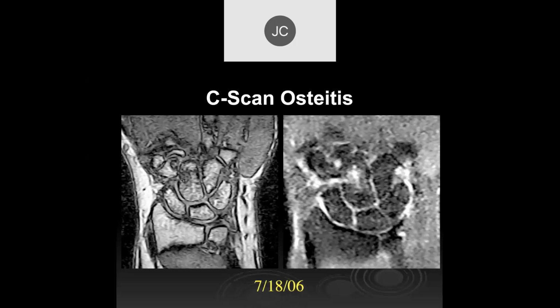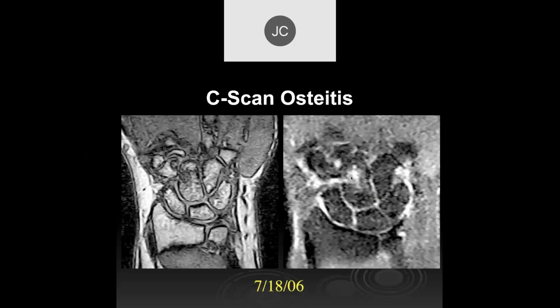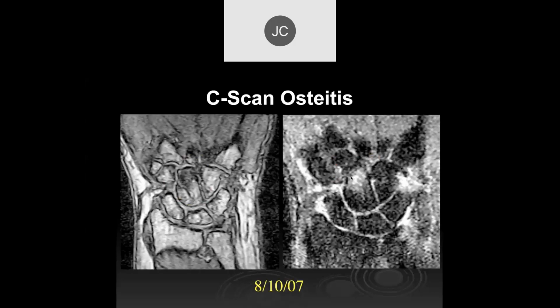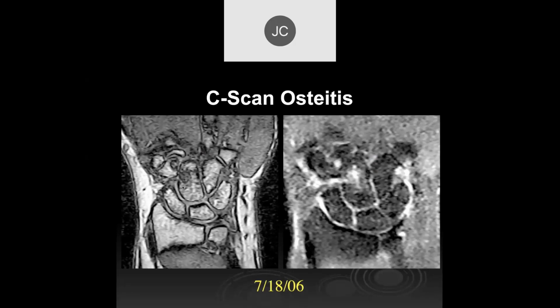Again, here we can see osteitis in the capitate on these low-field scans. And over time, this is 7/18/06. A little over a year later, we can see an increase in the inflammatory disease involving the capitate. So MR is really, and other erosions here.